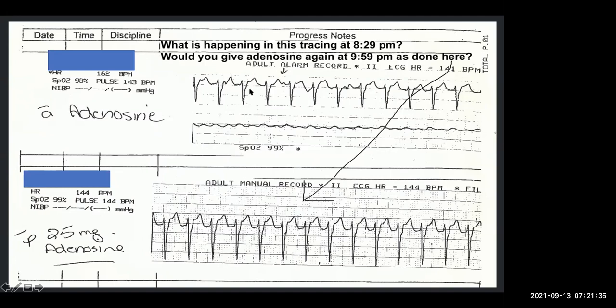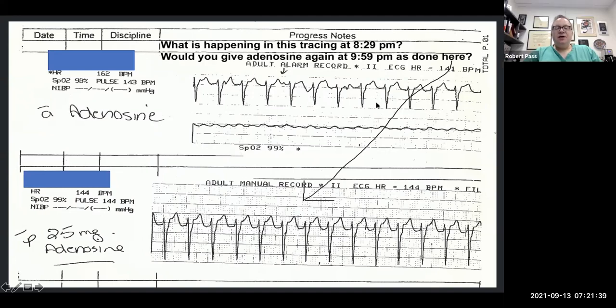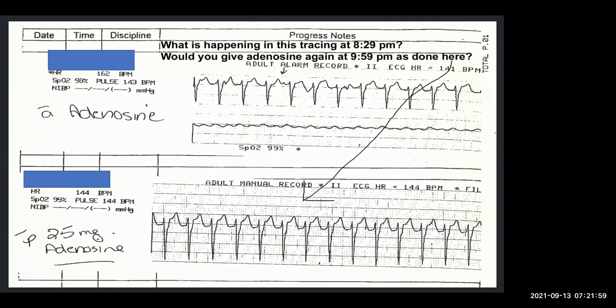Mm-hmm. And so if you had seen this, the next step, so now we basically know, how would you distinguish between VT and JET? So you are absolutely right. Your differential is JET or VT. How would you then distinguish the two? This is not a post-op patient, so you don't have any wires, unfortunately.